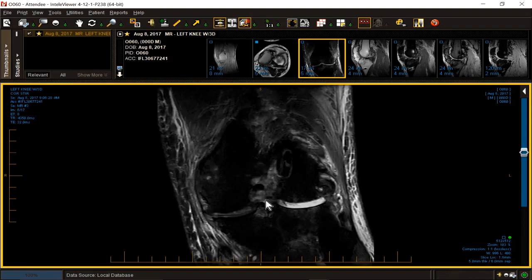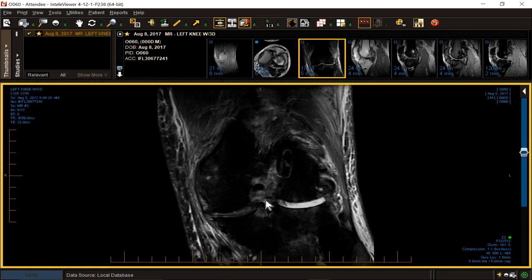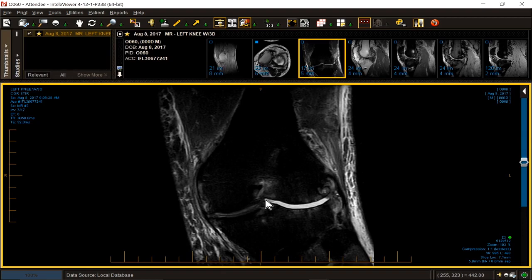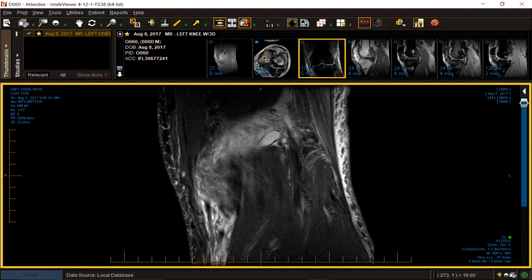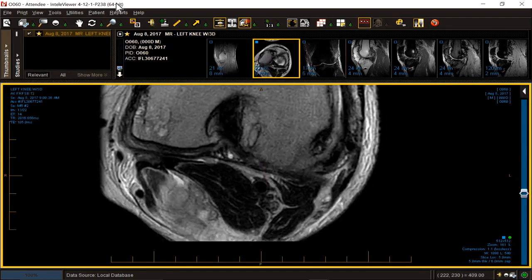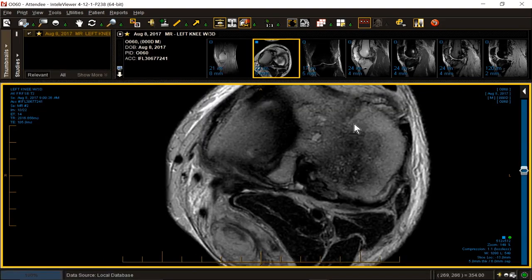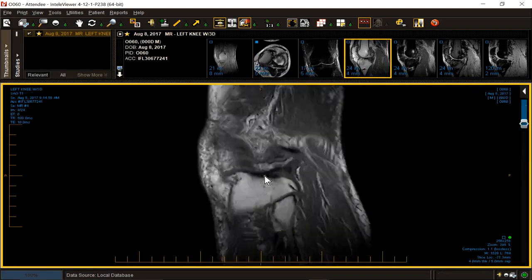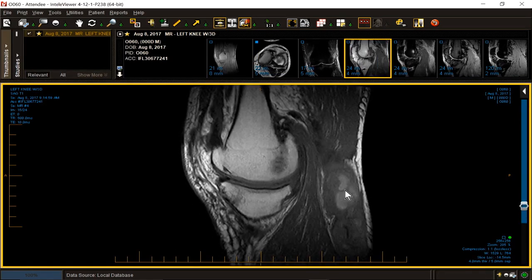He has a severely arthritic knee, and we could spend hours talking about the degree of arthritis that he has. By the way, he jogs. So what's going on? Why is his calf getting bigger? Because on Eliquis, he is bleeding into his Baker's cyst. Let's take a look at the T1. How do we know it's blood? It's got methemoglobin staining in it.